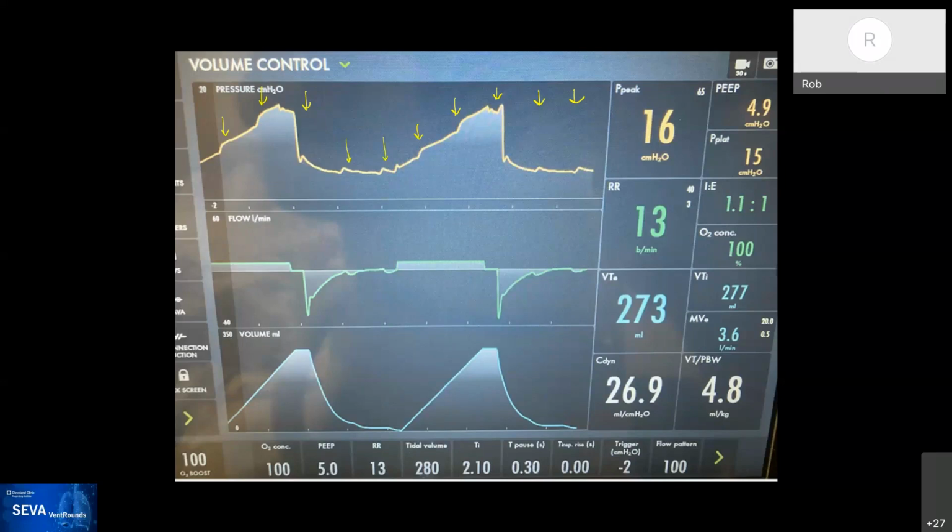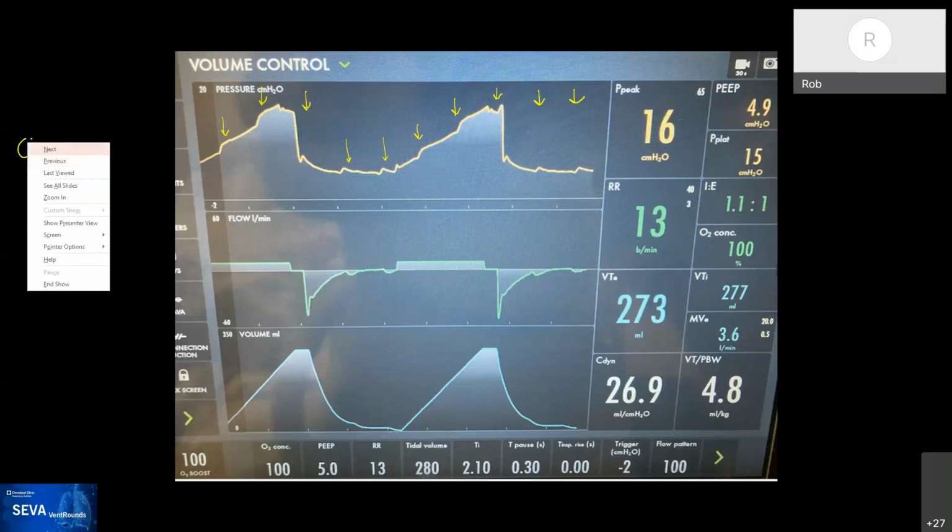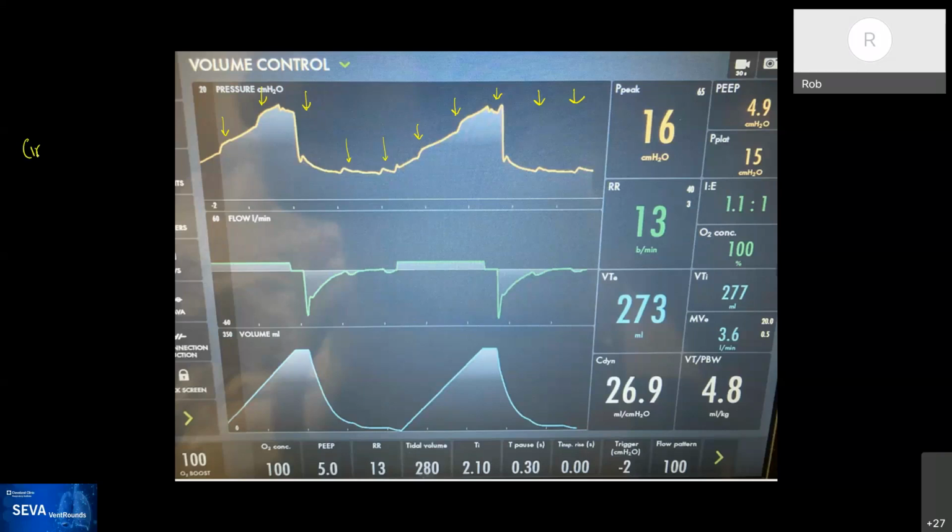First of all, on ventilators that offer automatic tube compensation, you will note that it has no effect in volume control on inspiration. It can only affect expiration. So endotracheal tube compensation for resistive load only works in pressure control for inspiration, not in volume control for inspiration. It'll work on some ventilators for expiration always, because expiration is always pressure controlled. Does that make sense to everybody?